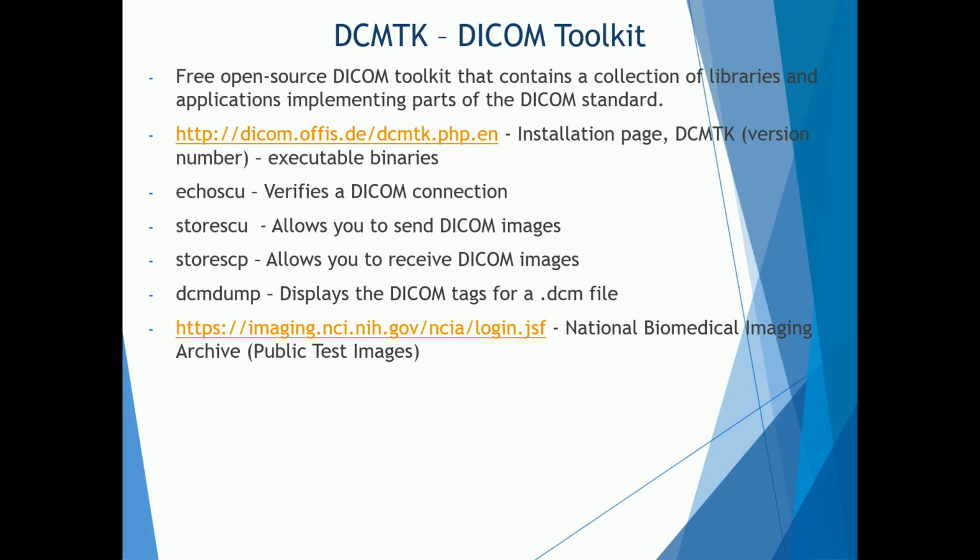We also have storescu, which allows you to send DICOM images. Storescp allows you to receive DICOM images. And dcmdump displays the DICOM tags for a .dcm file, which is typically the extension for a DICOM file. And these are just some of the common implementations of the DICOM standard.